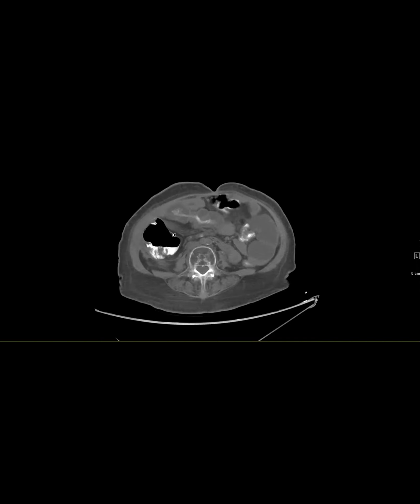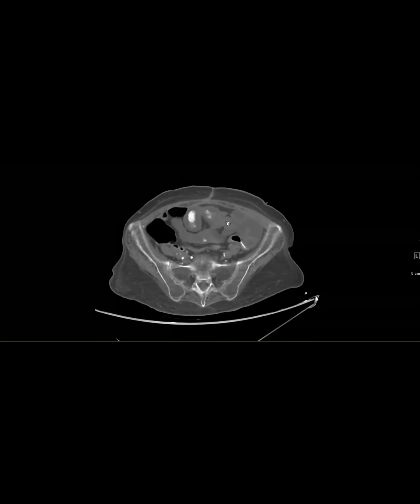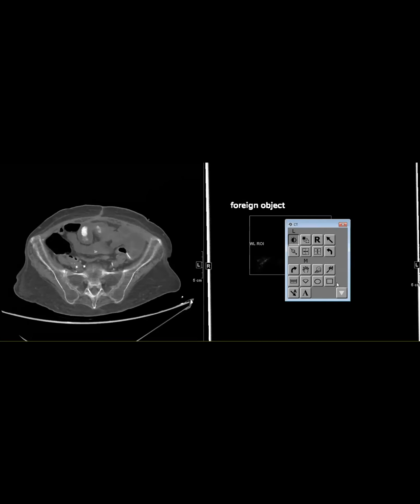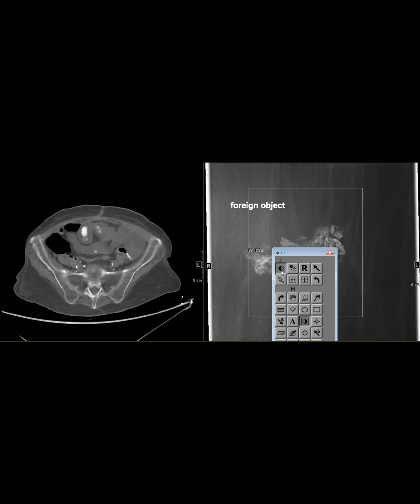Very thick and edematous. I'm thinking about lymphoma again, but it's a pretty long segment. Doesn't look like adenocarcinoma. Right. Doesn't really look like ischemia. Right. Okay. So then the patient went to the OR, and intramural hemorrhage. Right. So all those are correct, all the things that you think about when we think about thickened bowel. The patient went to the OR and they did an X-ray of this.